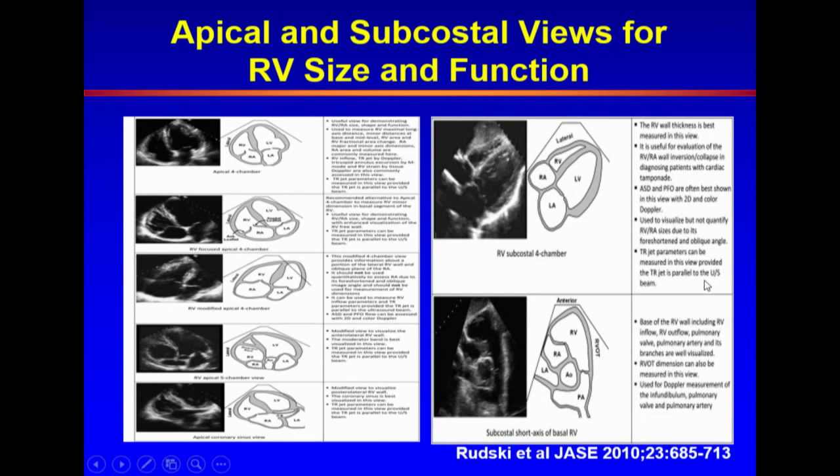If there is pericardial effusion, compression of the RV, this is a very important view you want to focus on and plan on. Sometimes we see patients with obstructive airway disease, no good parasternal windows, but you can do a solid exam, solid in that it gives you a feel for, say, LV function, not necessarily details of accurate size quantification, and it also is a view that can get you the pulmonic valve, RV outflow tract. You can get very solid sampling with the flow here with pulse wave Doppler, so remember that view as well.